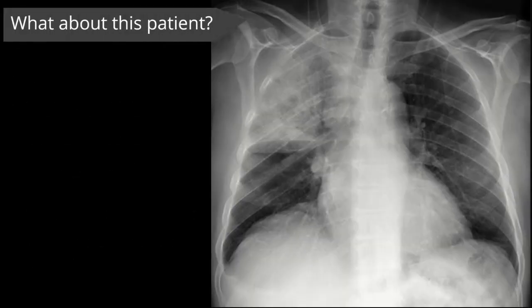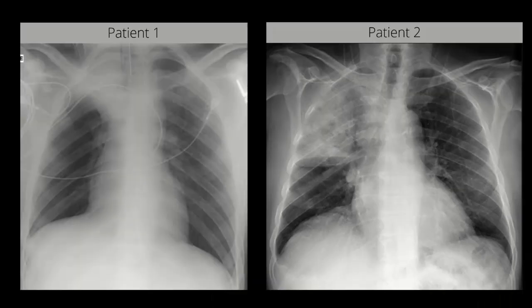This lung also has an issue, a different issue. This is a completely different patient. What do you see with this patient? Here are the images from the two different patients to compare and contrast their conditions.